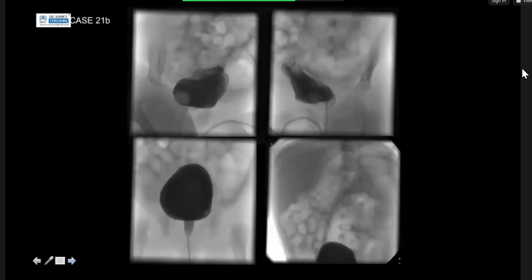So the patient then went on to have a micturating cystourethrogram study, which is a fluoroscopic study. So if you want to discuss these images, candidate 3. Yeah. So I can appreciate the cystographic views demonstrate a filling defect on the right side, and the bladder gradually fills up without any diverticulum on the later filled images, and there's no reflux appreciated in the last delayed images. So again, this supports the obstructive ureterocele that was seen on the ultrasound.